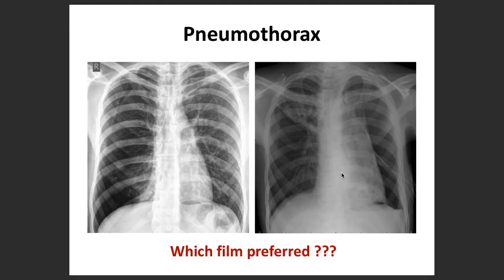run, run, run, emergency. You should try to immediately start arranging the things with which you are going to intervene. A lot of times a procedure has been done, an ablation procedure or a cath procedure, and then the patient complains of shortness of breath and all. Then you get this X-ray. So this is the time for action. So this is how you differentiate.